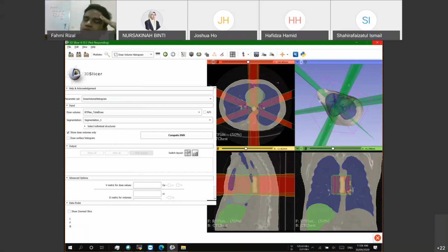Okay, I think it is better that every time you finish something, you play safe, because in my previous experience using 3D Slicer, I loaded a lot of dose images inside it. I even used up to 10 gigabytes of RAM for the Slicer only.